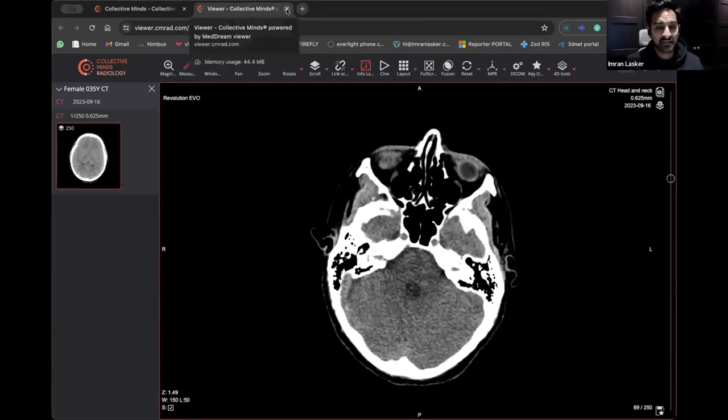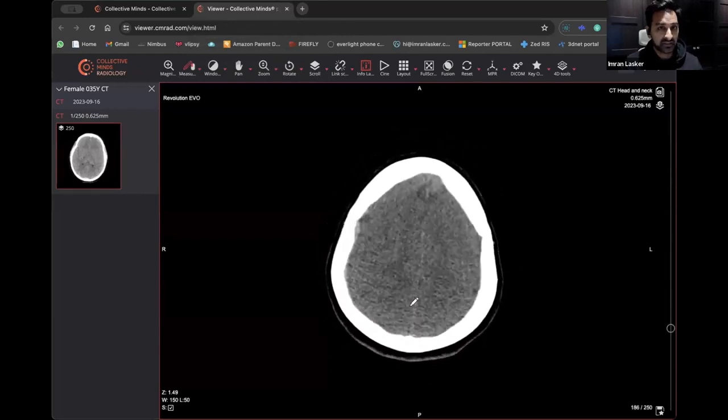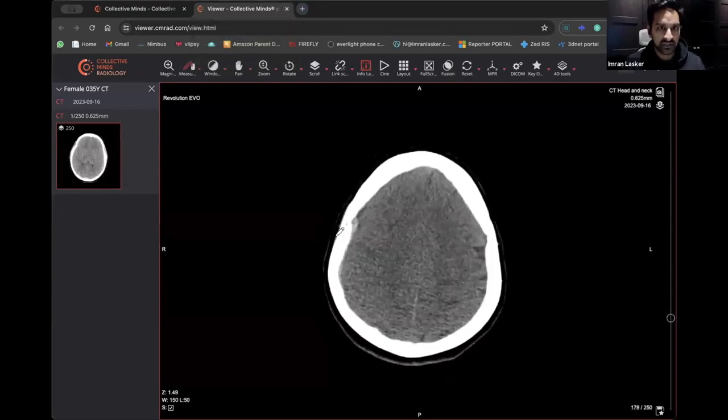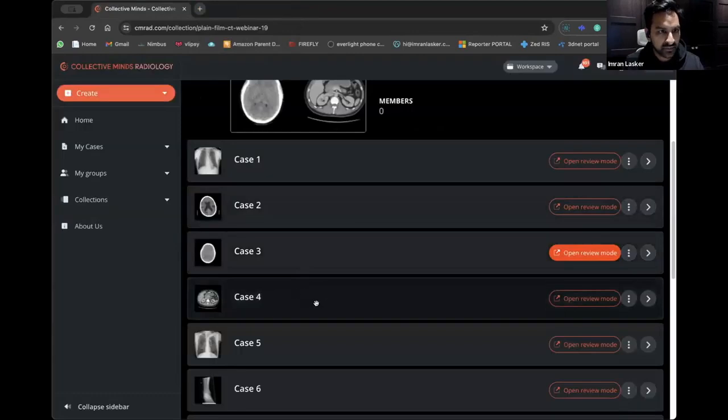So quite a few findings in this young person. And I know people have said, "Oh, is it a cerebral edema?" This person's very young, all right. And I think one of the ways to do it is just have a look at the skull vertex and see if the CSF spaces there are kind of a softish sign to see whether it's actual edema, so cerebral hypoxic edema, right? So good. A few people have got that, and actually, you guys got that quite quickly.